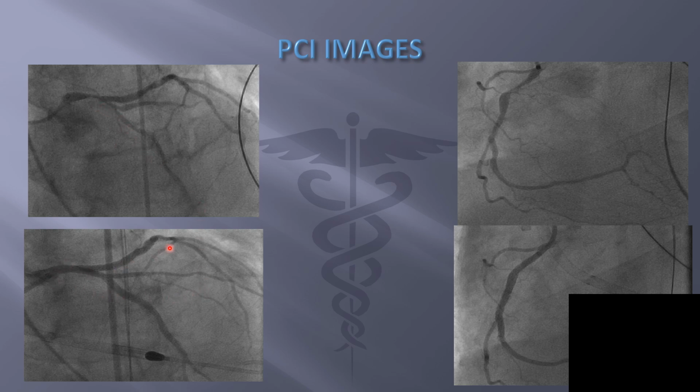They ended up stenting that. We placed an Impella device, as you can see there. He also had occlusions in his right coronary, before and after. This patient, after a 30-day course of being in the hospital, eventually went home and recovered.